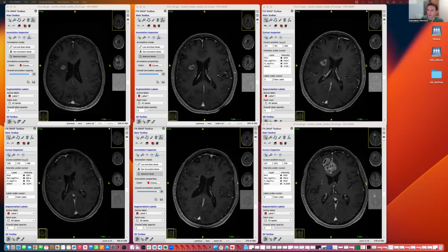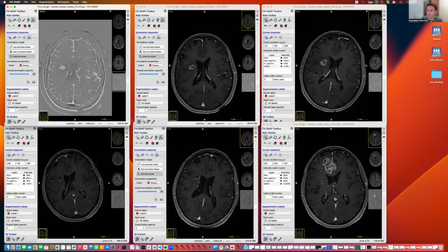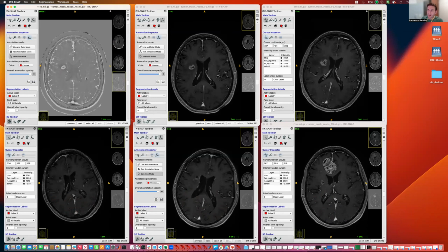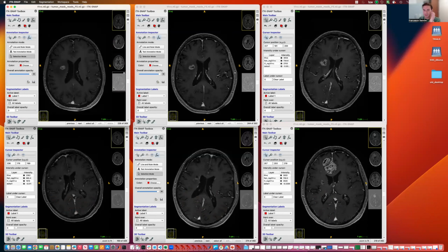I forget if I said it already, but of course I open up FLAIR or T2 at least, and T1 pre-contrast, and we also have subtraction maps between T1 post-contrast and T1 pre-contrast to get an actual idea of what the contrast enhancing tissue is. So in this case, we're applying RANO 2.0 for contrast enhancing tumors, so only contrast enhancing lesion components can be target lesions.